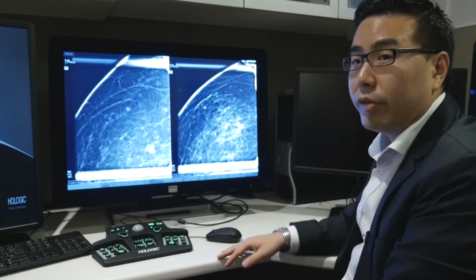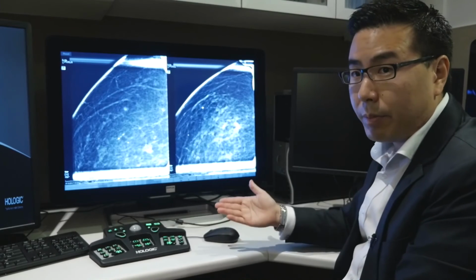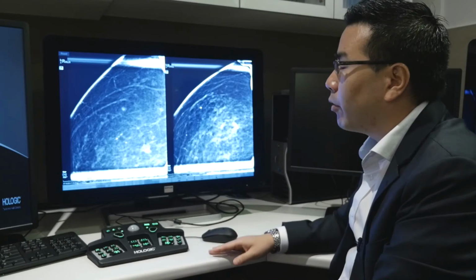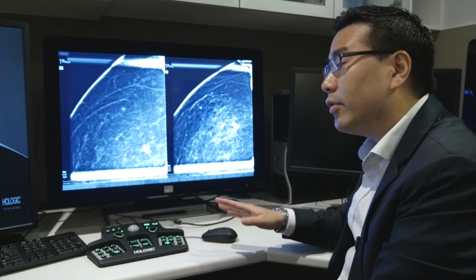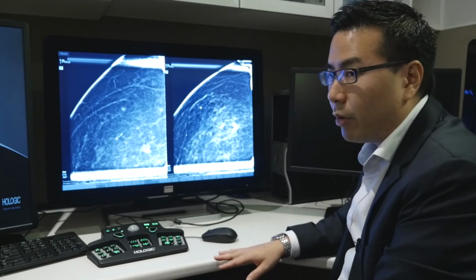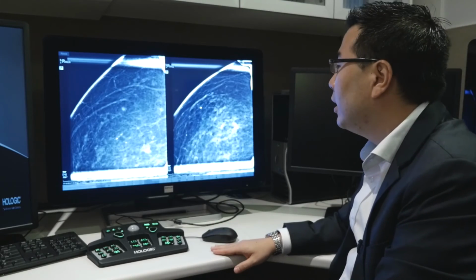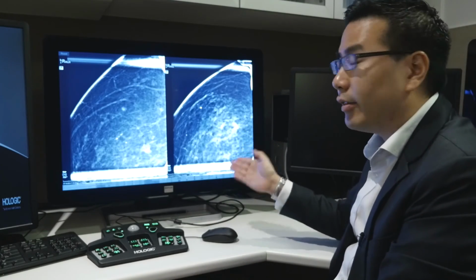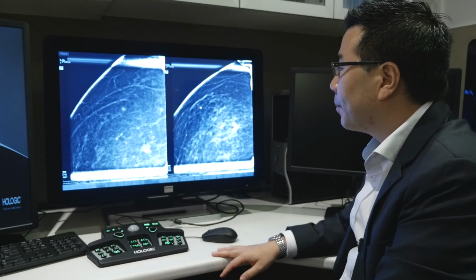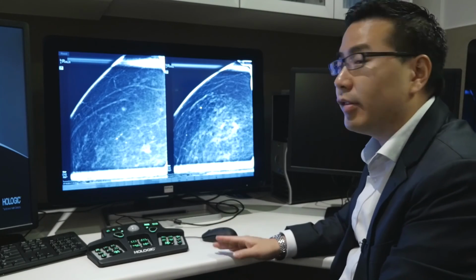The patient's referrer was a breast surgeon, and before proceeding to biopsy, he asked if I could compare with the previous mammograms that she had had at BreastScreen, which were cleared a year ago. I had a look at those mammograms, and there was the suggestion of a subtle density in this region, but with the surrounding normal fibroglandular tissue, it was cleared, and it certainly wasn't obvious on those images at all. It looked like the density had significantly progressed, even when you compare with the 2D views that we obtained. But certainly with the tomosynthesis, it increased our level of confidence in diagnosing a suspicious lesion quite a bit.